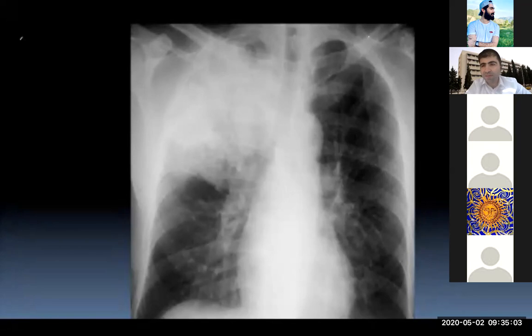Sahand. Sahand? Yes, doctor. Okay. Dr. Sahand, can you tell me what you see, according to the system, to make a sample? So we can interpret this chest X-ray.